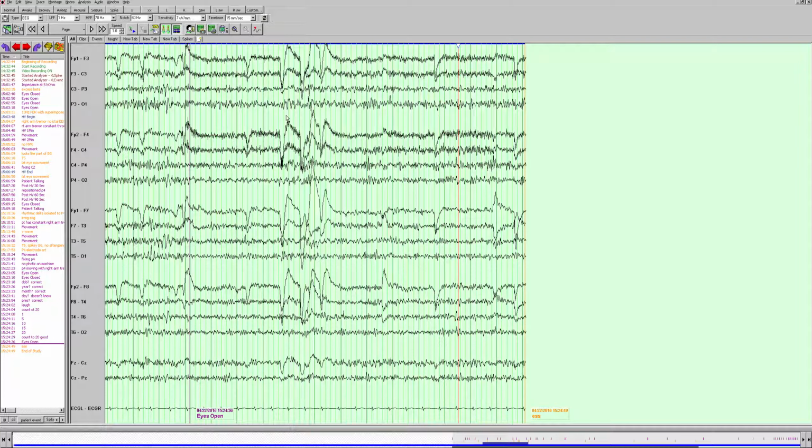So this is an abnormal EEG. I would say it's a mildly abnormal EEG due to the presence of abundant beta activity, and this is likely secondary to medication effect from benzodiazepines or barbiturates. And you do want to mention that no epileptiform activity or electrographic seizures were seen.